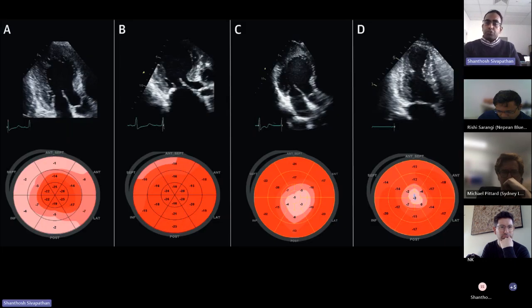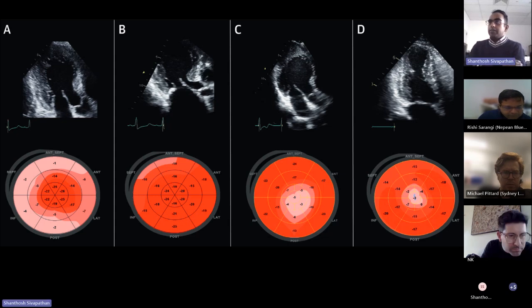Lastly, we'll just go through a couple of examples of bullseye plot, and I've mentioned some of it to you. The first one is reasonably easy because I've kind of mentioned it before. Anyone want to describe that pattern? Panel A.